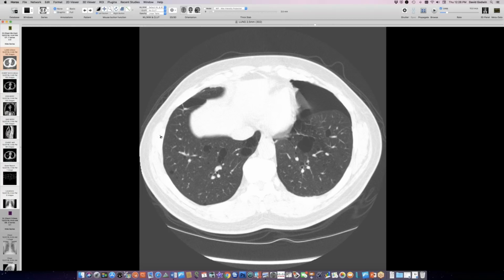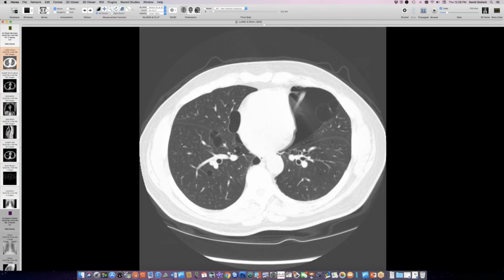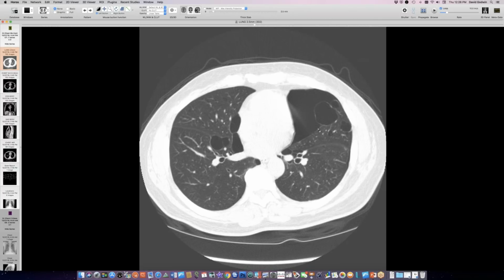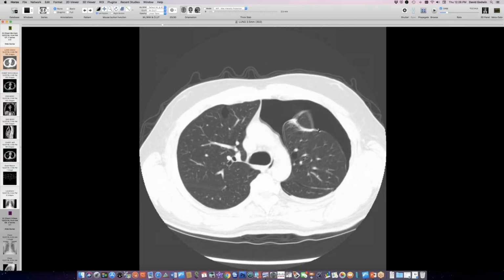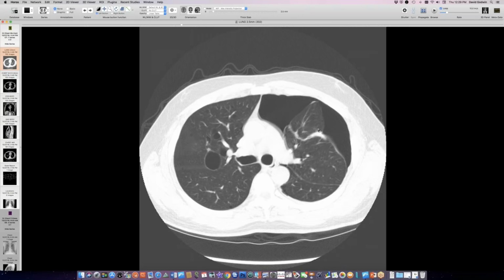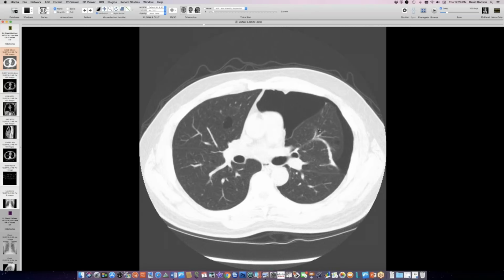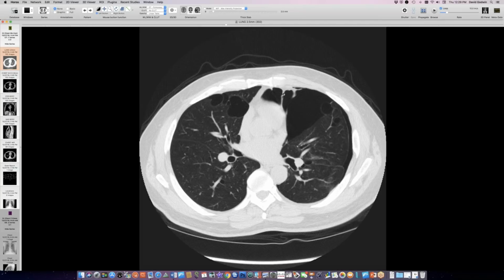And on a side note, if you don't mind, can you show us, if you scroll through the pneumothorax anteriorly, the little fronds of tissue that protrude into the pleural space? We talked before about extrapleural fat sometimes being dragged in. If you hit mediastinum, are those little fatty projections coming from the parasternal anterior chest wall? A little bit lower there, a couple. There you go. Yeah, and I think the abdomen and pelvis CT actually showed a nice big fat globule along the left heart border as well.